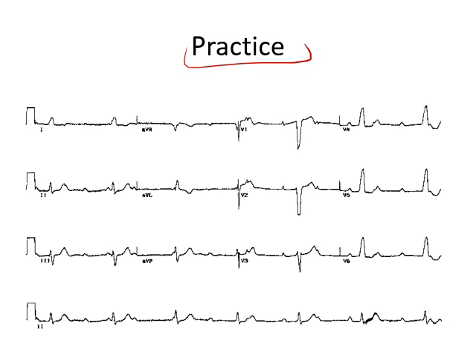Alright, let's start marking the P waves and the PR intervals. This is a lead 2 where we are marking P wave and PR intervals. So this is one P wave, this is one P wave, and immediately followed by it is a QRS complex. So this is a PR interval. This is one more P wave and this is a QRS complex. So this is a PR interval.